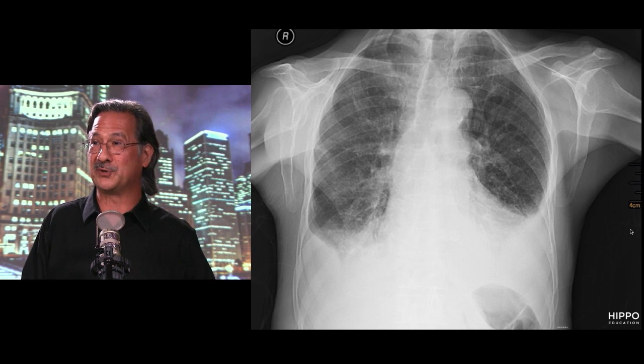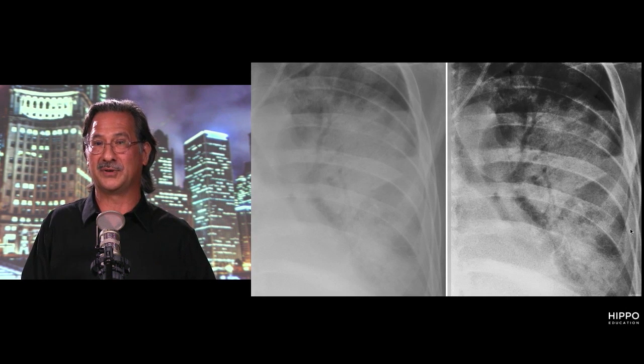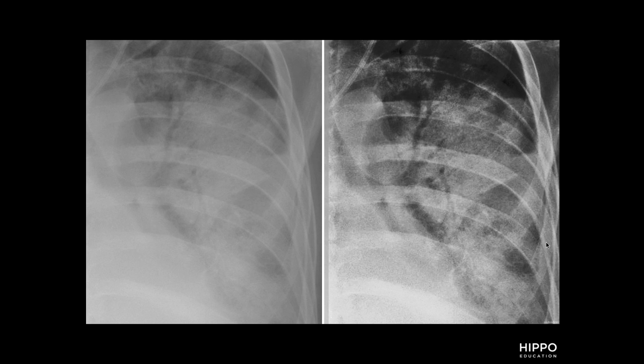But let's contrast this. So this is fluid in the pleural space. Let's contrast this with fluid in the parenchymal area. This is an example of an air bronchogram. Here, let me just show you what we're talking about. So here's the bronchi, right? The airway tubes, that we can see here. The reason why we get that outlined here is because we have some fluid accumulation, like cells from a pneumonia, right? Some kind of fluid that's around those regions, so that it's almost like a sponge. Yeah, it highlights the air fluid interface. Exactly. So here we get this air bronchogram. This tells you that the fluid is in the parenchyma, not in the pleural space.